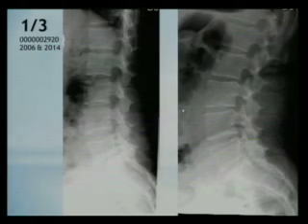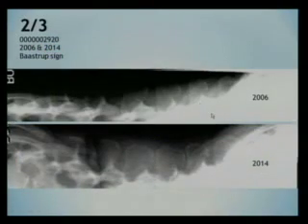Okay, this is a patient in '06 and in '14, and I challenge you to come up with the abnormality. Where is it? Okay, I'll help you out. Same pictures but more selected. And what do you see is different in '14 from '06? The spinous processes. I can hear you. Spinous processes, yes. Precisely. Or as they say here, bingo, right?